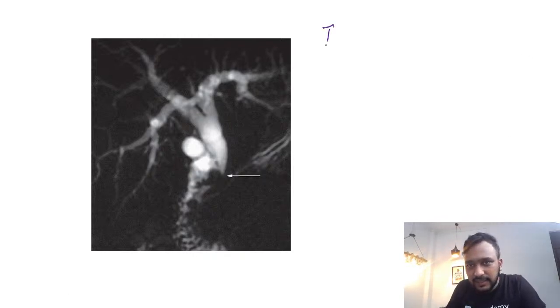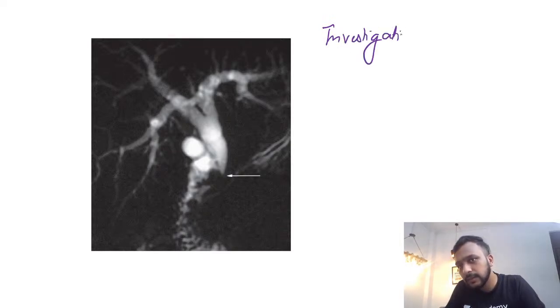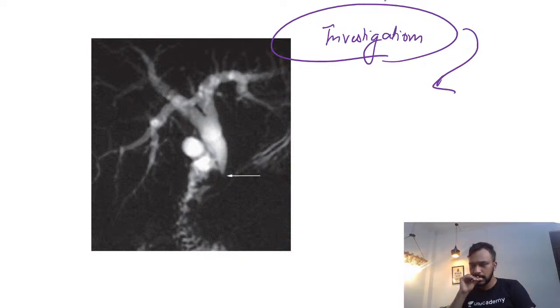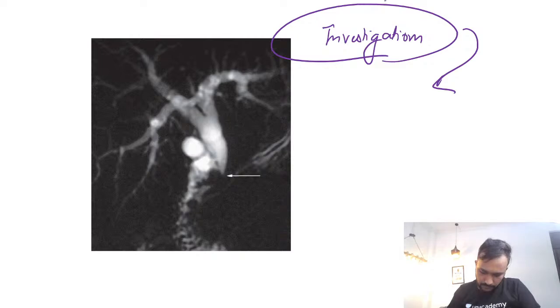What is the investigation that I am showing you in this image? Anyone who can tell me what is the investigation that I am showing you? Anyone guys, what is the investigation? This investigation is your MRCP.